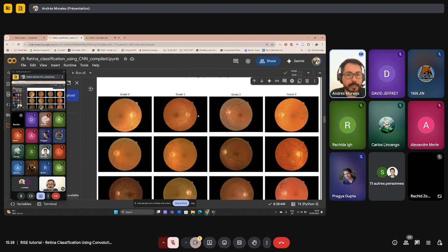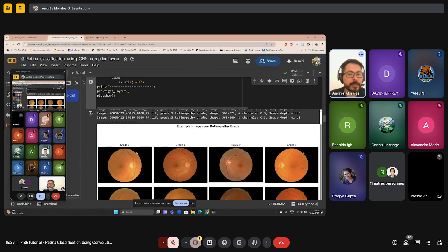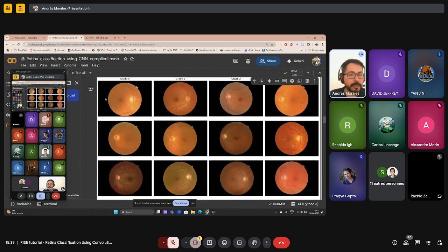There are several things that one should notice here, which are also important for later processing. The first one is that the images are not square, they are rectangles. We can also see this from the size of the images: the width is bigger than the height. And as you can see here, it's basically black space, dark space, so it's an empty image.